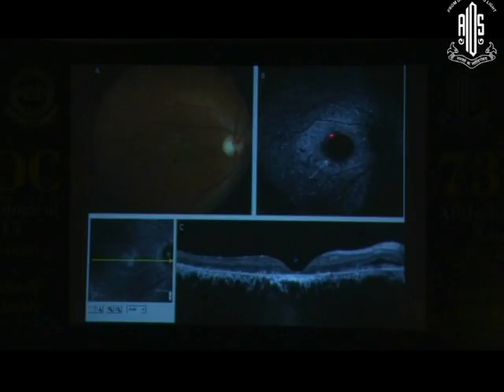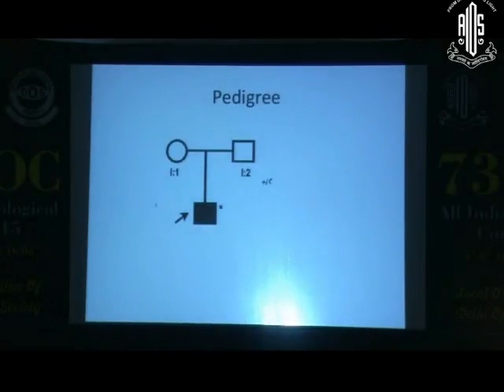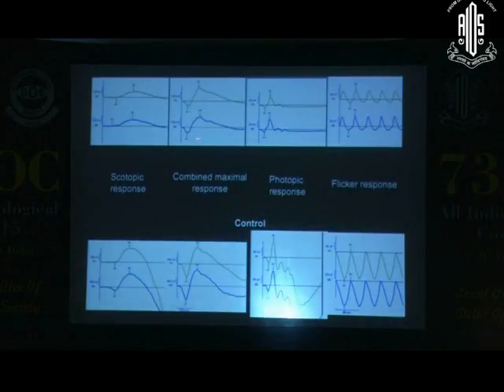And the FAF confirms that significantly. This is one thing that I want to emphasize, that fundus autofluorescence is extremely helpful in patients with dystrophies. So that's the hypoautofluorescent RPE atrophy, that's the lipofuscin-laden hyperautofluorescent area, and all those flecks that are either hyper or hypoautofluorescent, and the loss of the ISOS is there. That's the other eye, similar looking, only son of non-consanguineous parents, and that's the ERG.